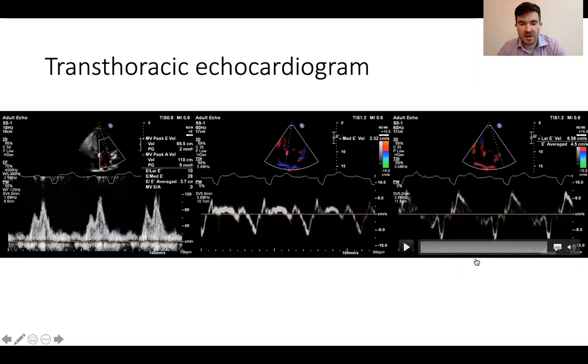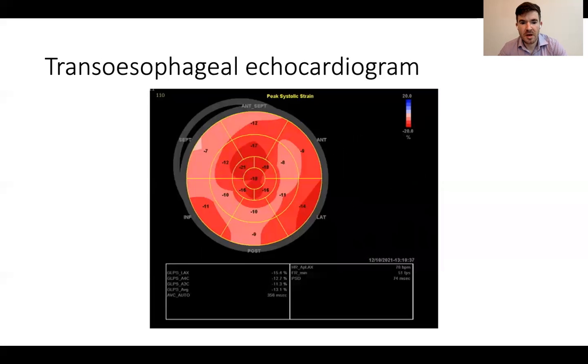As you might expect, her tissue velocity of her mitral annulus E primes was significantly reduced. And her strain was reduced at -13%, a global longitudinal strain, with really a patchy reduction, but particularly her basal septal regions were reduced.